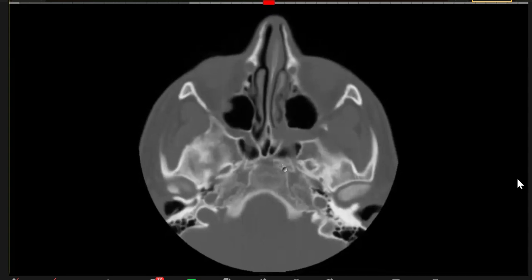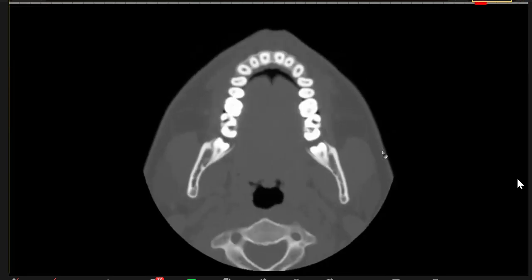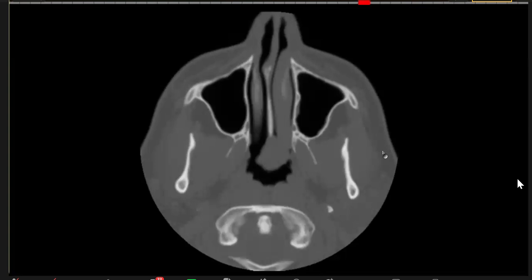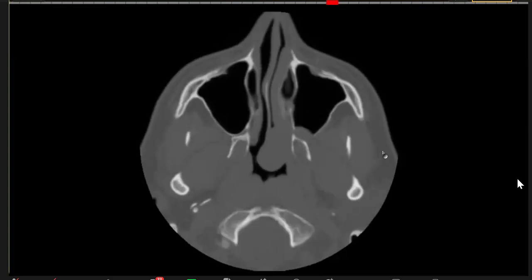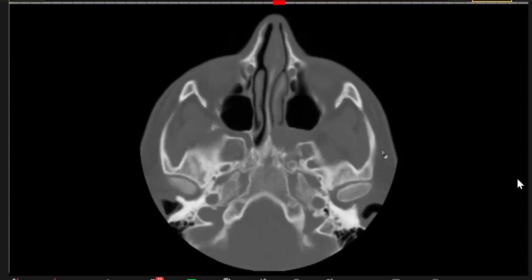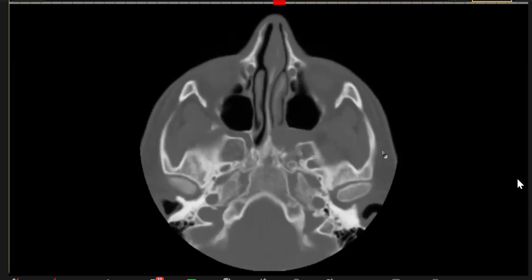Okay, sir. So just give me 1 second. So this one. This is the normal, and this is the abnormal widened one.